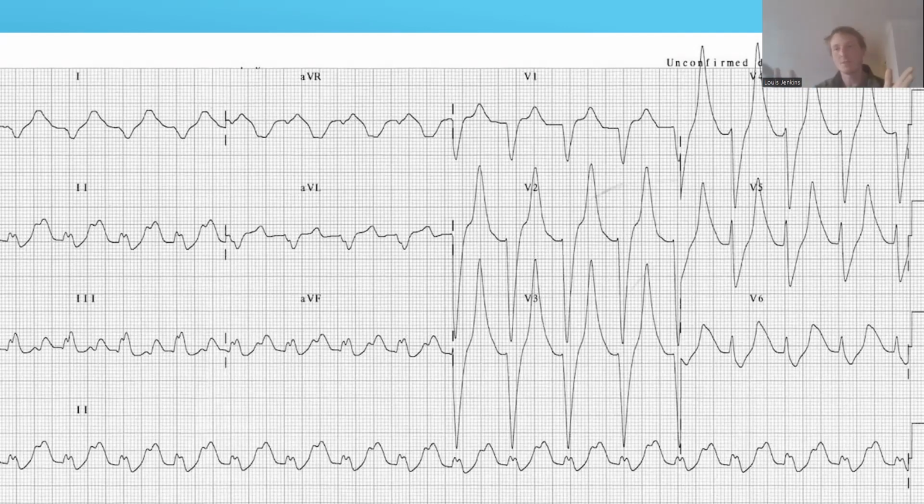But anyway, I'm going to interpret this ECG. So looking at the first impression, this ECG is a mess. I've never seen an ECG like this before, and it looks wild. I don't even know what is what, if I'm being honest. And I'm sure a lot of you feel the same way. I mean, what is even going on here?